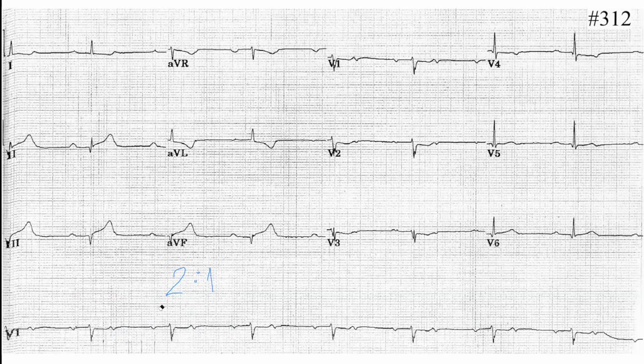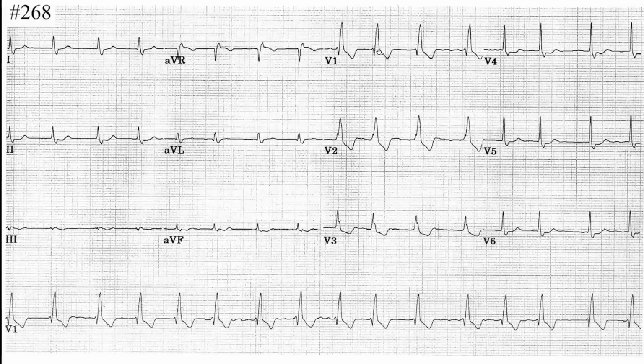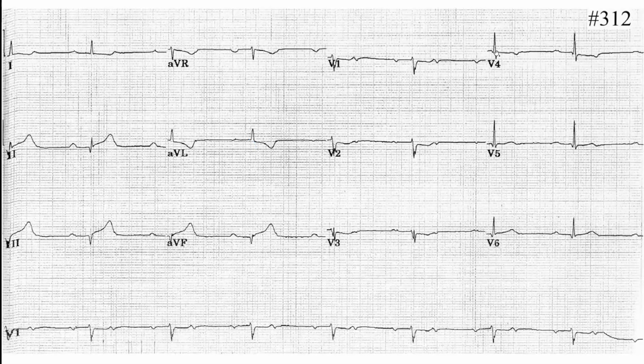Okay. Go on. So QRS is narrow or wide? QRS looks wide in AVL, in V1. No, it's not wide. It's narrow everywhere. When you talk about wide QRS, it has to be wide. For example, now I can go back. See, that's wide. That's not wide. Okay. Thank you. It's not wide. You're welcome.